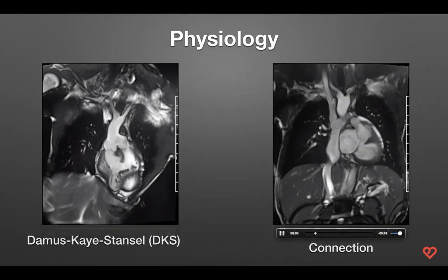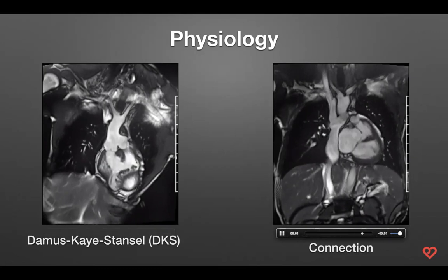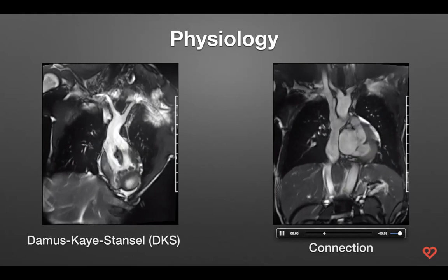Here, you see how we're getting blood flow back into the pulmonary vasculature. You see the IVC coming in through the liver, and this is your Fontan, which is anastomosing to your PA, and here's your SVC coming down to your PA. This is an extracardiac connection.